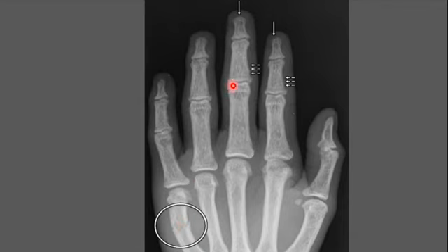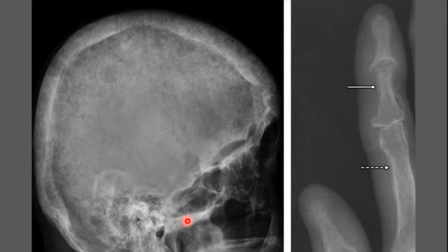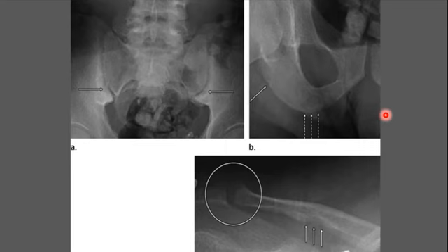This is a picture where we said subperiosteal bone resorption and acro-osteolysis in the distal phalanx. There is a fracture. This is a salt and pepper appearance, as we said, and this is, as we said, smudgy trabeculae and tunneling. I didn't see tunneling exactly. This is subchondral bone resorption, as we said, and this one is subtendinous resorption at the site of the hamstring and the adductor.